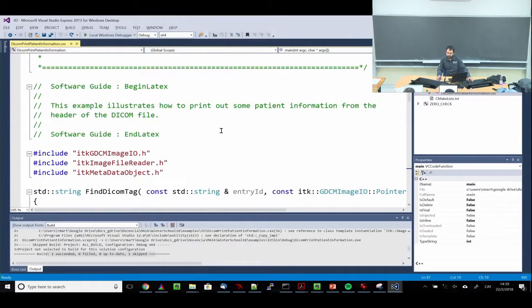You understand everything? So the idea of this first thing will be to understand what we are doing, to run the program with the parameters that you have, and see that it's doing what it's expected to do, which is now printing the tags.